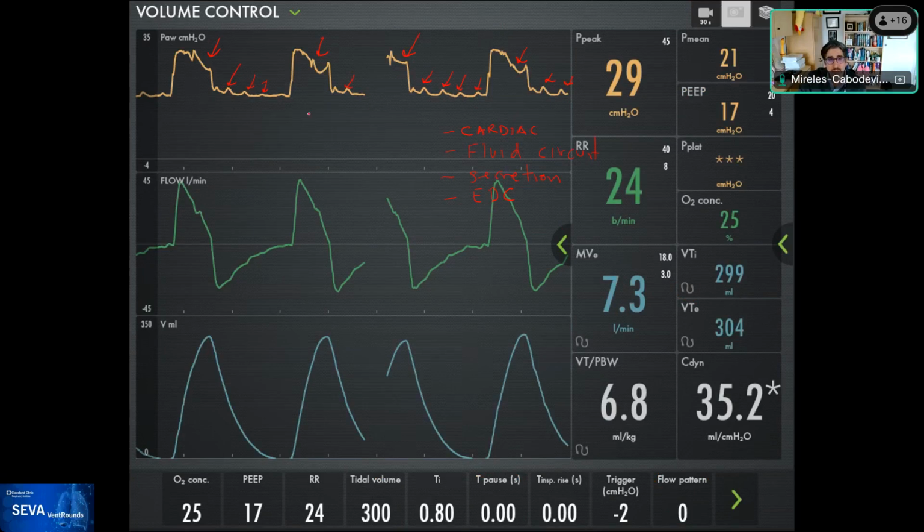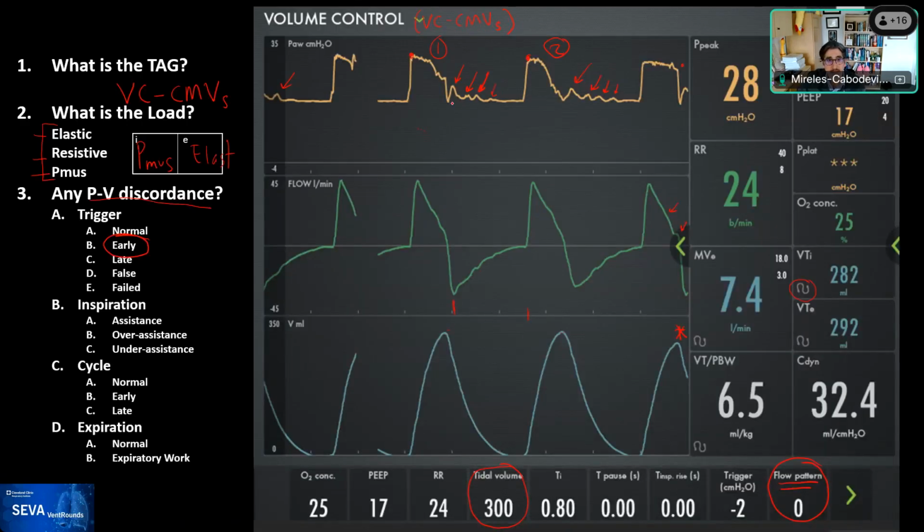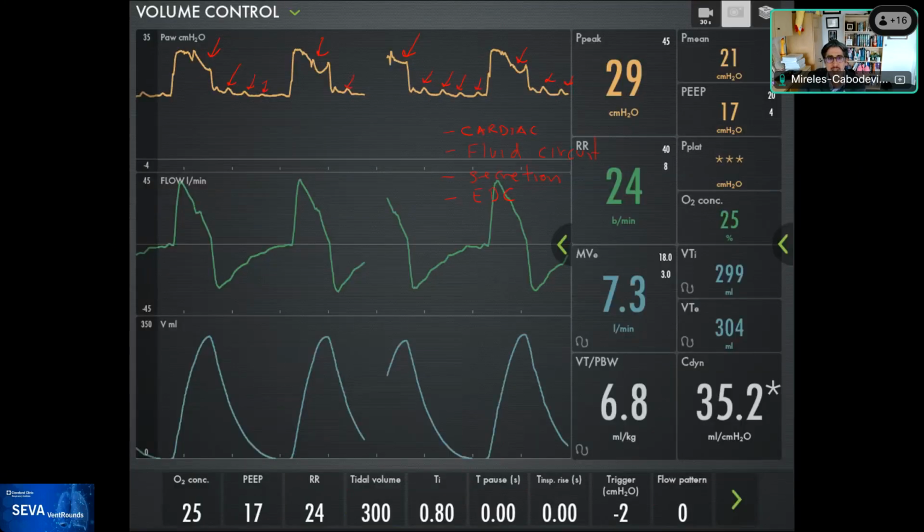The second, look at the frequency, and if you consider this to be a second, from here it starts 1 second, and here finishes a full second. 1, 2, 3, 4, four in a second. So that means that in 10 seconds it's 40. And multiply that times 6, and it's a lot, 240. So it's going very fast, right, for this patient. So the frequency is high, very high frequency, and it goes down with time.